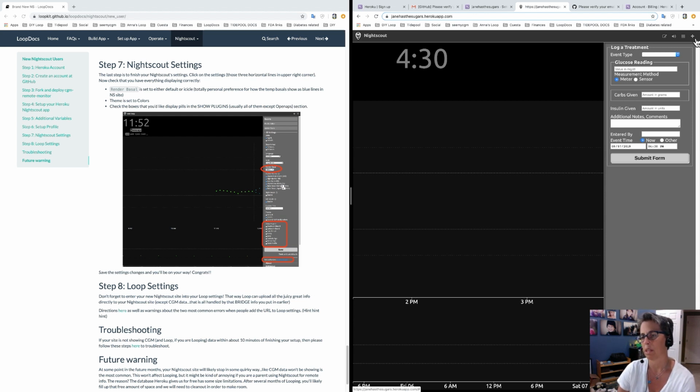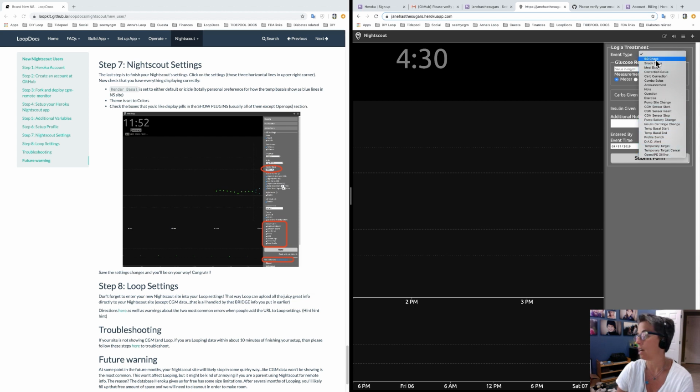That's your care portal. The care portal is where you can enter various different information about your diabetes management. So things like site changes, pump changes, temp basals, whatever you want to do are all in here. And the reason we put Open APS on the enable line is because these last ones for temporary targets, if you're going to be using a version of Loop that has a remote temp target, those will only show up if you have Open APS on your enable line. And if you decide later to set up IFTT, they will integrate with these things. So that's a side note.